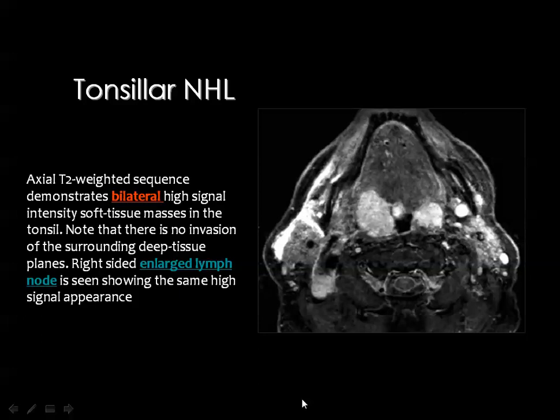This is also a non-Hodgkin lymphoma of both tonsils being more on the right side, associated with metastatic or lymphomatous involvement of this node posterior to the parotid gland.